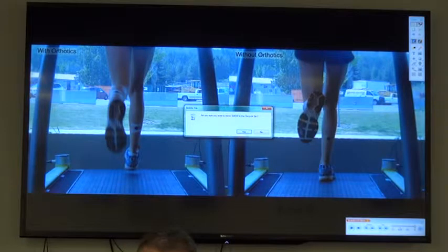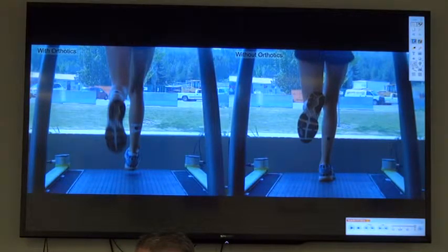Then I would draw another angle in which I would connect the 2 dots. And now we have an angle of 94.3.